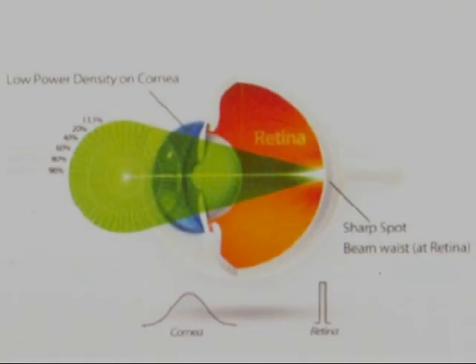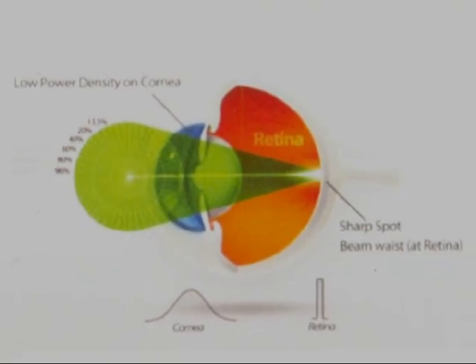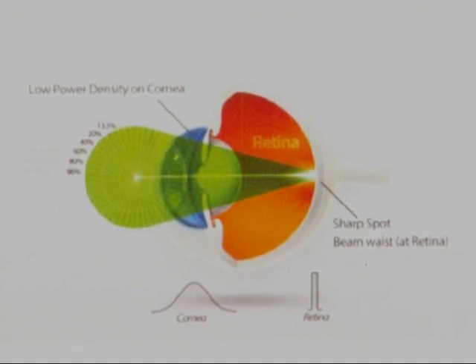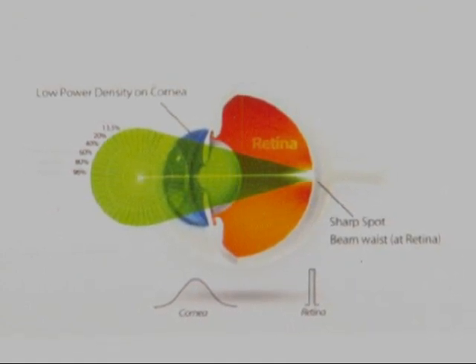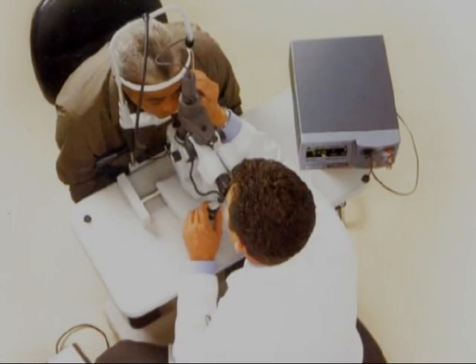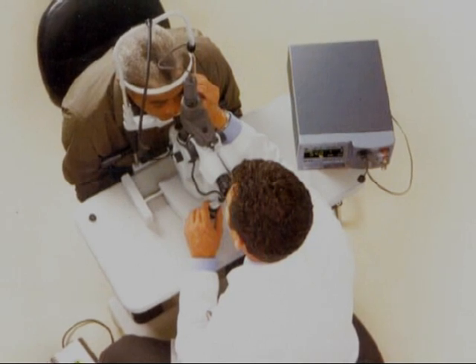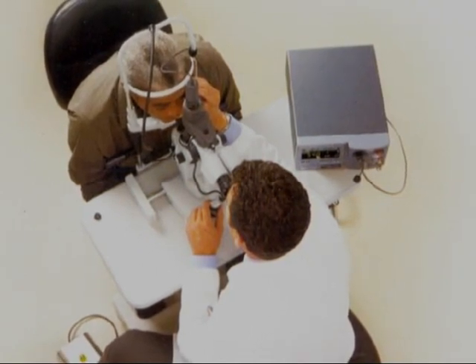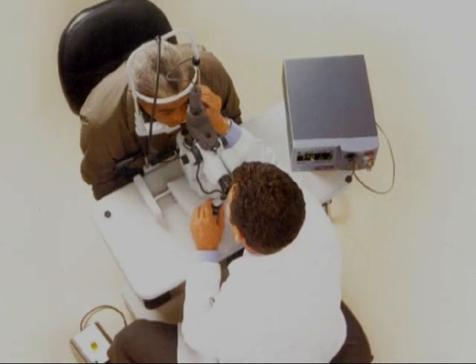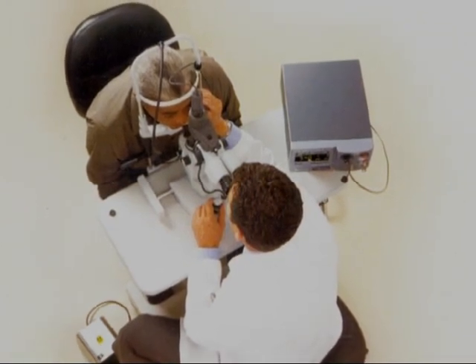Ever since the advent of lasers in ophthalmology, they continue to hold sway in the treatment of various retinal disorders, even in the face of threat from newer treatment modalities. This animation video attempts to highlight the basics of laser treatment for common retinal disorders, that is intended to help the resident or the novice fellow.